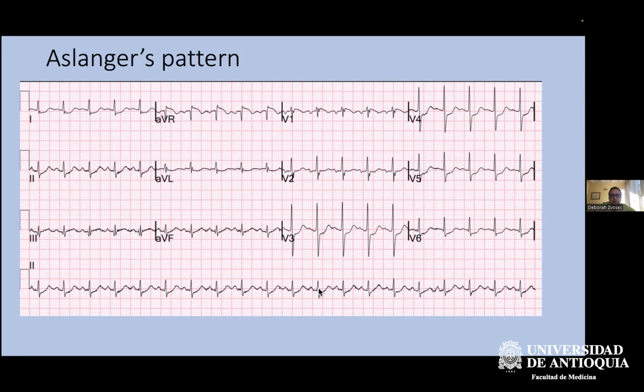It's not. Let me also say, it is not the height of the T wave alone. That's part of it, but there are three things which contribute to the area under the curve of the T wave. It's the height of the T wave, it's the QT interval, and it's the straightness of the ST segment that inflates the T wave to a large size. And then it always has to be in proportion to the QRS.